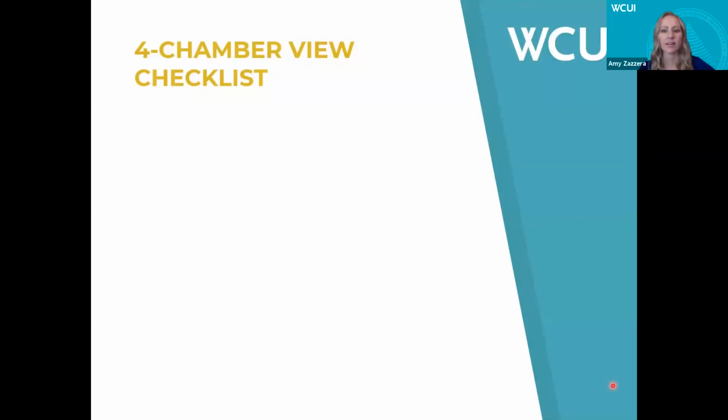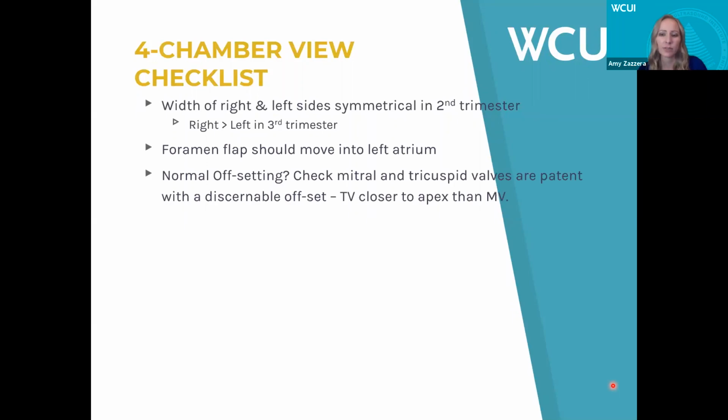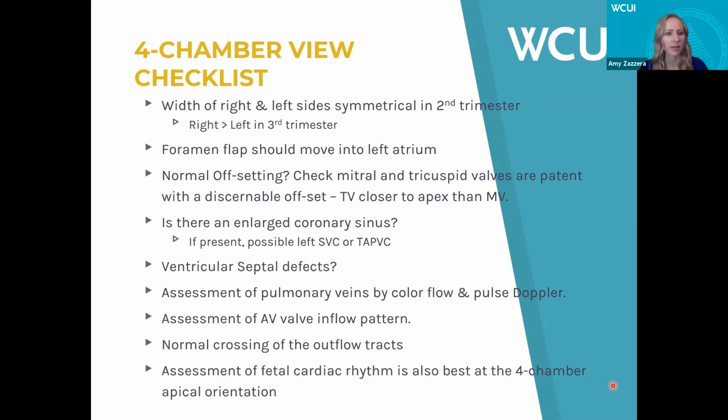And then here we have our 4-chamber checklist. This is like that mental checklist that we have in our heads. We just showed that 4-chamber is just one of many cardiac views that we do in an anatomical survey. We're not just taking a still image of the required views, but really evaluating the structure of the heart and all of these components. So it's good to have this checklist in your head. Yeah, it's a tremendous amount of information.